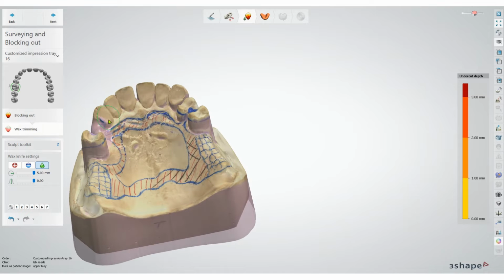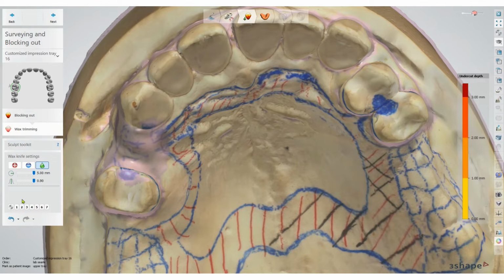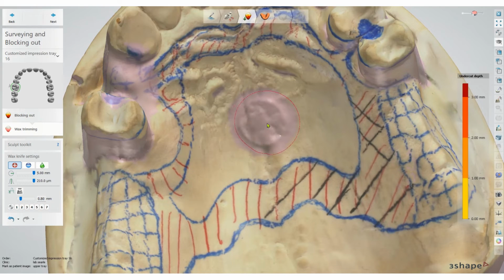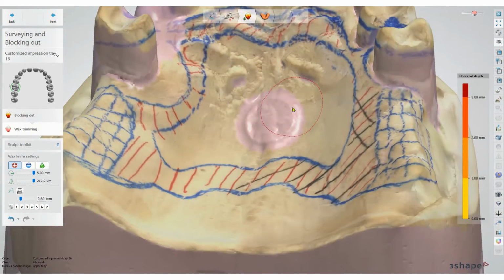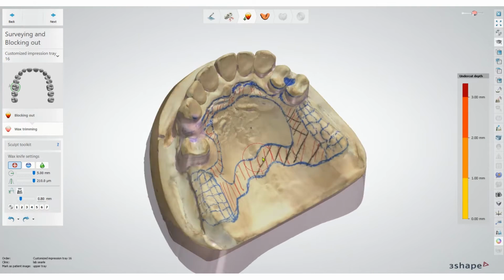One thing that you can do as well is in this section here, as you can see when I hit plus in this one here, you can have this set to be 0.8, and then you'll add it, and it will only add to 0.8 thickness going through the palette. So if you wanted to create a little bit more space somewhere else, you can.